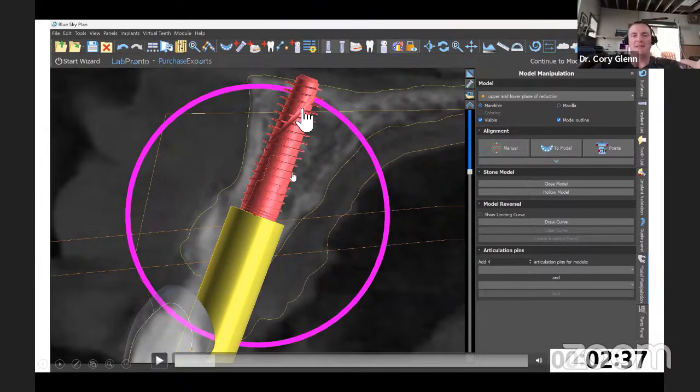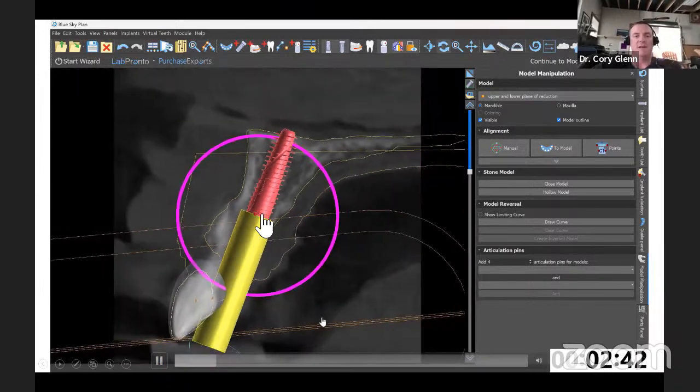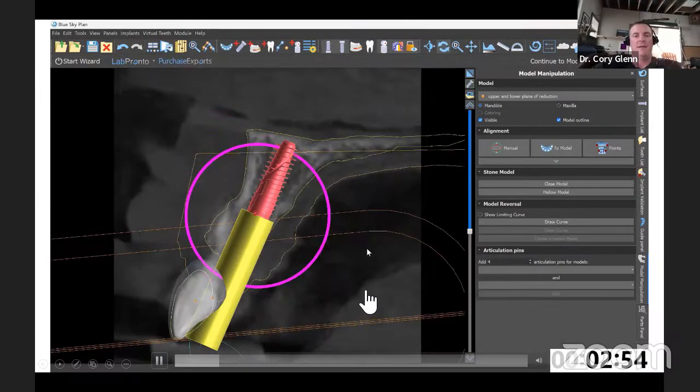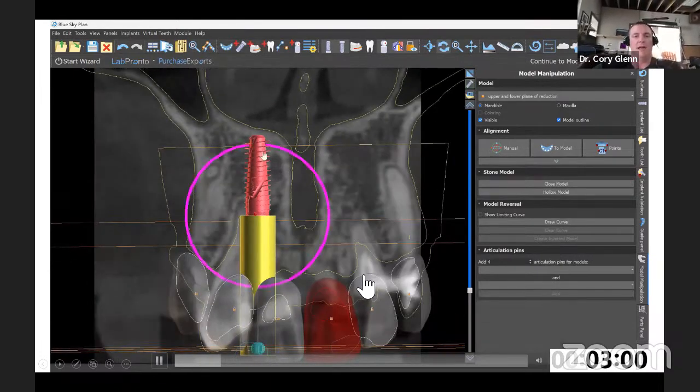Since a hybrid is what's requested on this patient, I'm going to position my implants deep enough that they're just above, below, however you want to think of it, this 16 millimeter clearance line, because that's how much bone is going to need to be removed for me to have room for these implants. So you're seeing me placing those just deeper than that 16 millimeter plane.